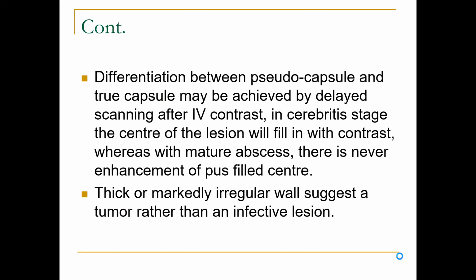Differentiation between pseudocapsule and true capsule may be achieved by delayed scanning after IV contrast. Sometimes, in early cerebritis and late cerebritis, you remember from the stages which we have seen for the abscess, in early and late cerebritis there is no actual capsule formation, but somewhat one can claim that there would be a pseudocapsule.